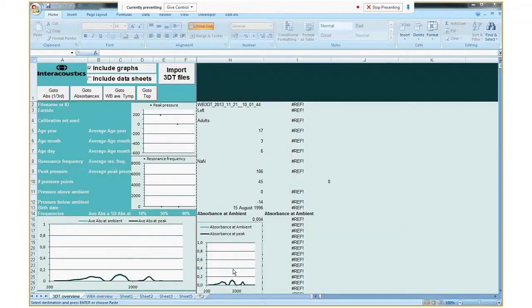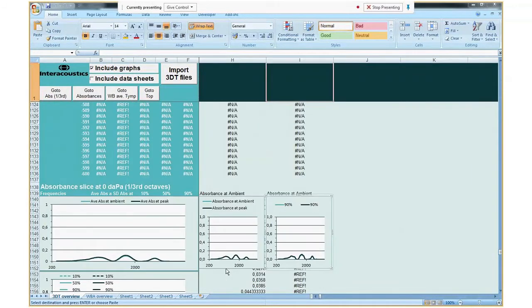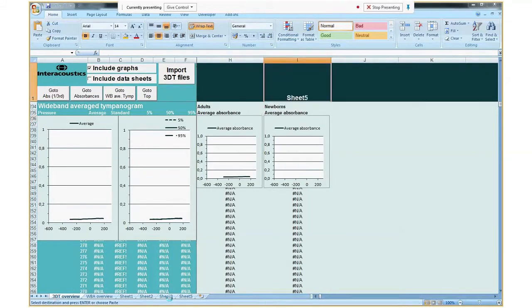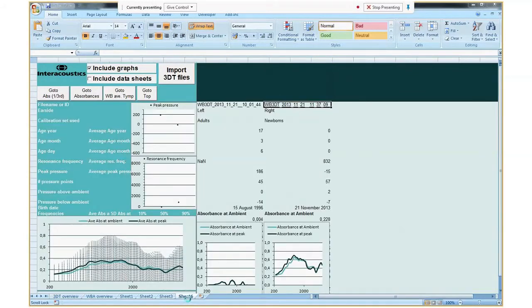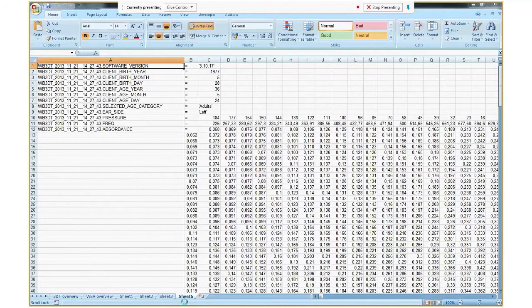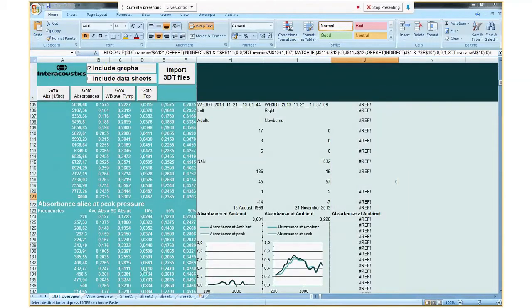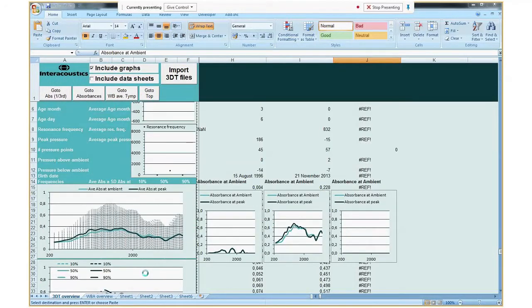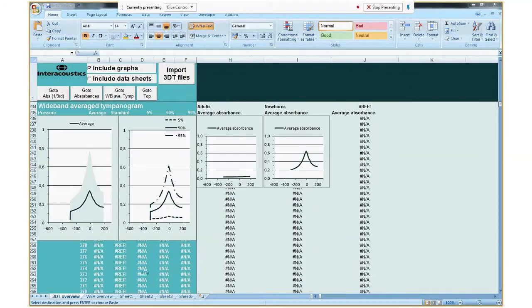Now, if we follow the import that is happening, you will see that we still have sheet 1, 2, and 3 from before because I didn't delete them. And now the sheet that is added each time gets 1 number higher. We are now at sheet number 6. But after the data is copied, it is also removed again, and then it will appear with sheet number 7 when it is importing the next data.